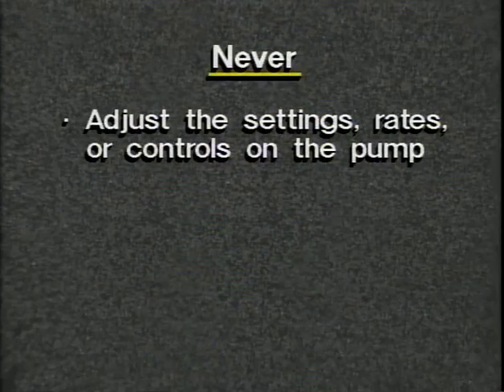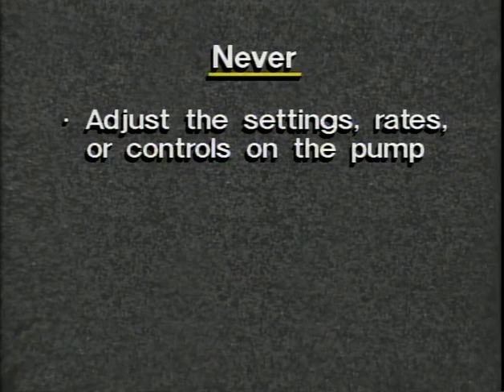In the home, the patient or private caregiver is in charge of the pump and medications. During this program, we will show you how to care for the patient while not disturbing the pump. We will also discuss your role in emergency situations. Just remember, never adjust the settings, rates, or any of the controls on the pump.